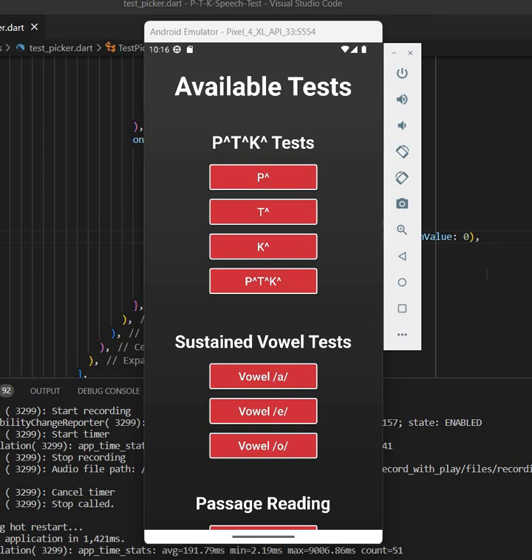Hi, my name is Tatiana Summerall, and this is a continuation of the introductory video. This is going to be a demo of the smartphone-based speech assessment project. It is a mobile application developed using Flutter.